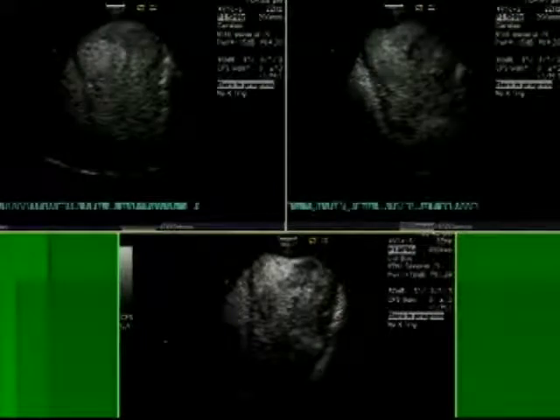These are contrast images, roughly the same images on the two top panels as we saw on the last, and then another example of an apical four-chamber with a little bit brighter contrast in the bottom panel. And we can see here that in fact there's contrast swirling, there's definitely stasis, but we don't see any protruding masses in there. We do, however, and this is best illustrated in the bottom panel, see that there is a mural thrombus layered in the left ventricular apex.